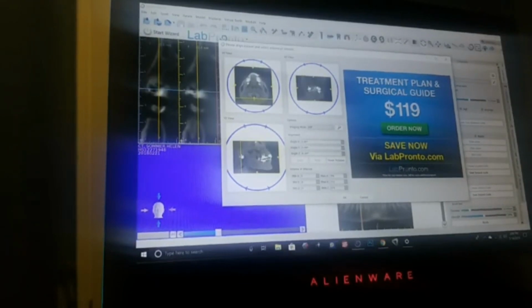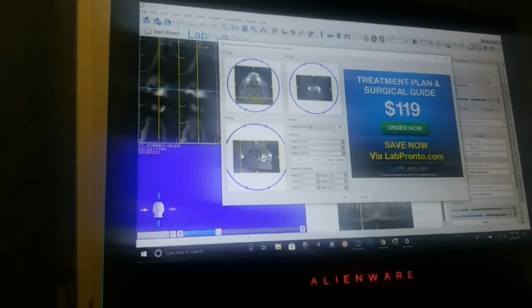This is exactly what this program is doing, and this is what you're doing at this stage. You're taking these images and telling the computer, okay, I'm not interested in this amount of CT scan out into the patient's vertebrae. I want to eliminate some of these images, and limit it a little bit on top and a little bit on the bottom, these dark areas where they're absolutely useless because there's no image in that area.